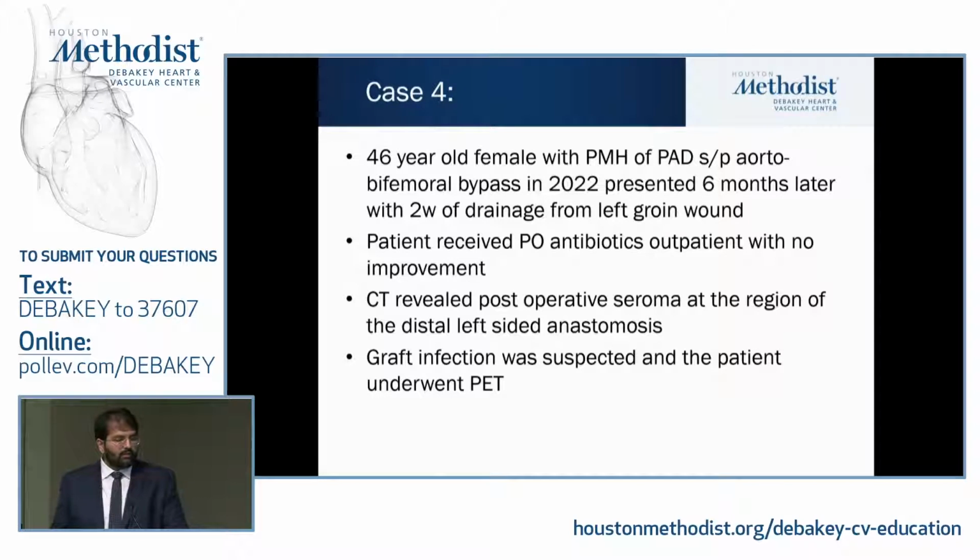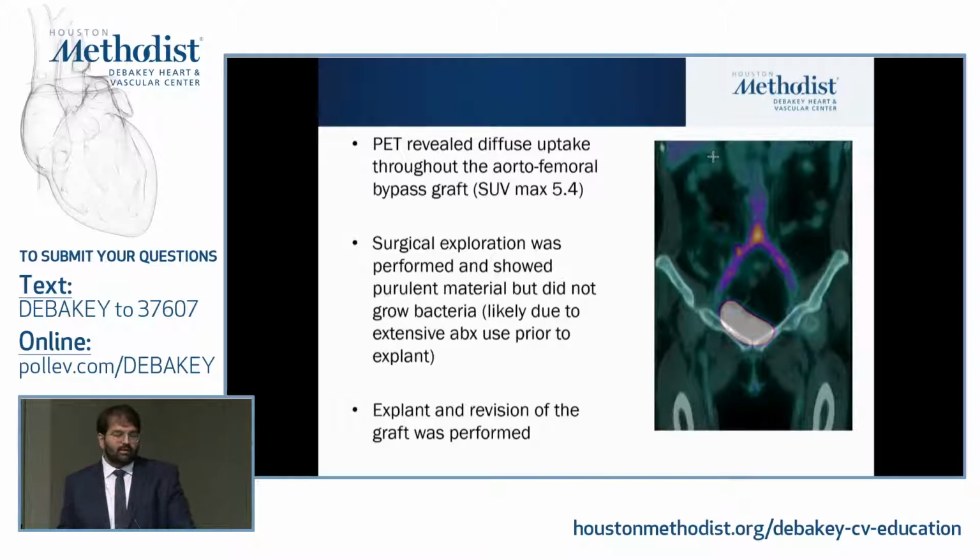Okay, we're running low on time here, but I'm almost finished. So this is our last case: a 46-year-old female with a history of PAD status post aortobifemoral bypass in 2022, presented 6 months later with discharge from a left groin wound. She had received a lot of antibiotics, both outpatient and then in the hospital, and a CT showed a fluid collection, but nothing specific. So she underwent a PET, and as you can see, this is the aortobifemoral graft, and there's extensive uptake throughout the graft.